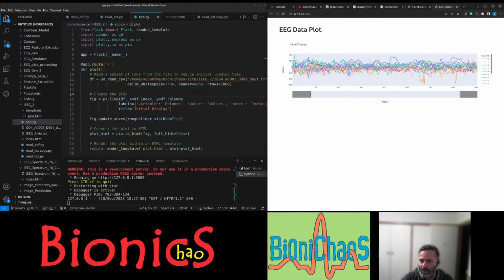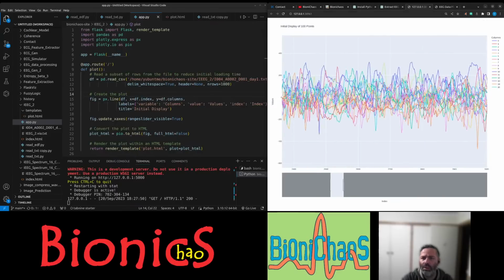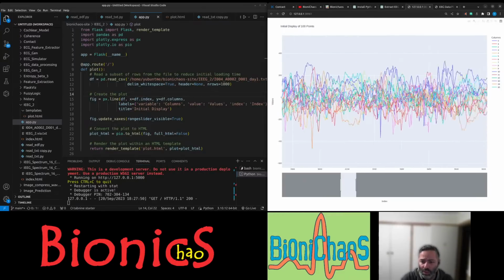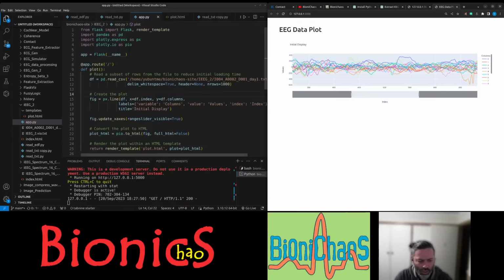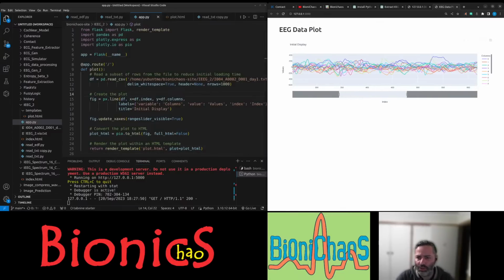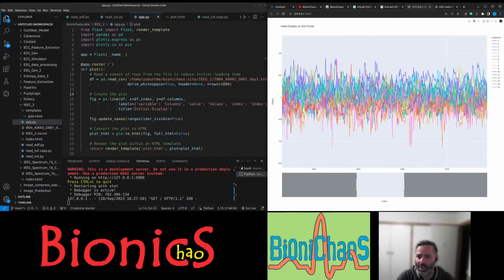Yep, it's running, but why did you remove? Looks like you removed some stuff. That's no good. Why did you do that? Don't do that to me. Yeah, we're loading 1000 and this should display 100, but the rest of the file should still be there.